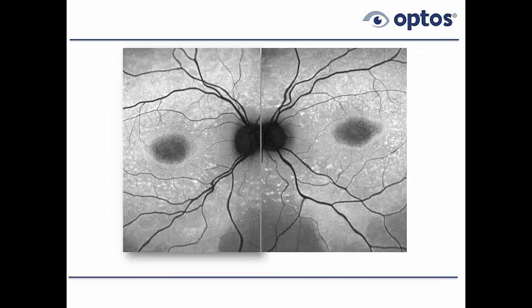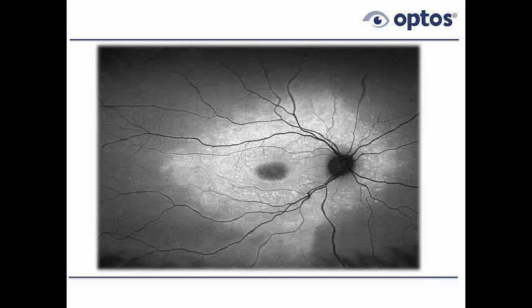And if we compare both together, the right and left eye, we see this very close symmetry of the right and left eye. And this is typical for inherited disorders. Notice that the macula is oval, or at least the lesion is oval, and it's darker than it should be, which means, by definition, hypoautofluorescence. And as I mentioned previously, with hypoautofluorescent images, the photoreceptors are going to be involved. When we do OCT on this patient, the photoreceptors are actually missing.